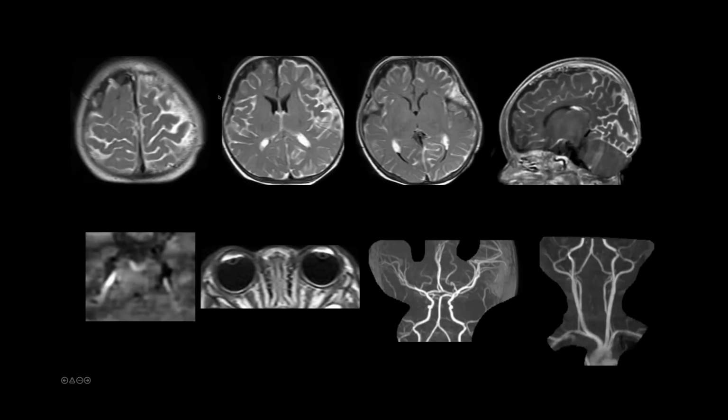Post contrast, you can appreciate the extensive pial angiomas on both sides. The choroid plexuses are also demonstrating angiomas. I'm not sure if the ocular examination was done and if these are ocular abnormalities. The globes appear slightly thickened on both sides and also demonstrate some degree of contrast enhancement. No arterial abnormalities.